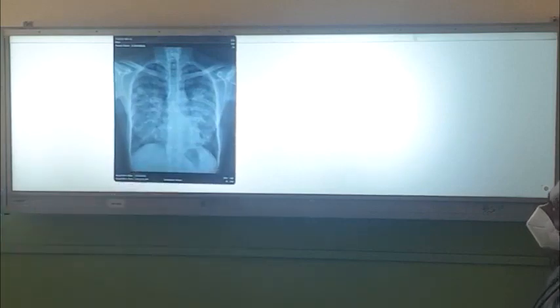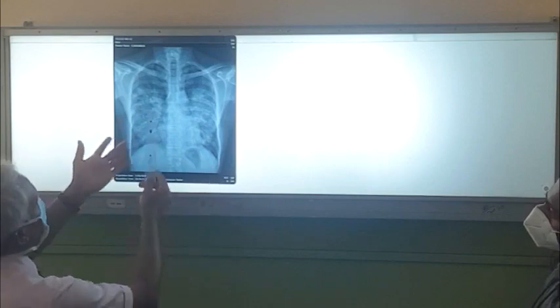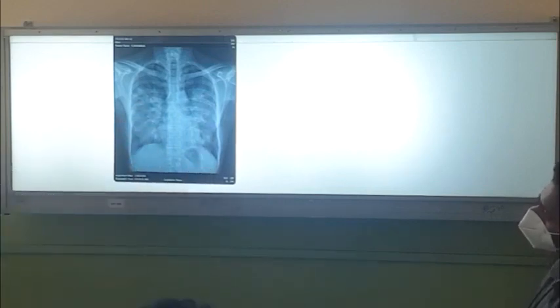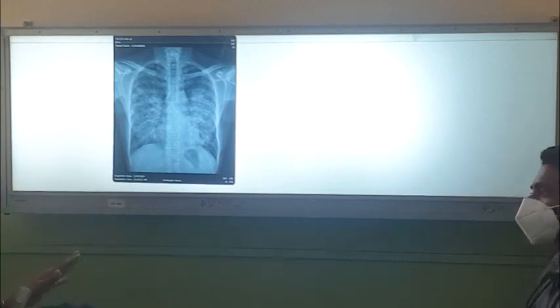This one transferred from the mother. Now we can't see the cardiac borders, perihilar, reticulonodular opacities are there, right? When you see this, think of pulmonary edema, think of atypical infections like pneumocystis, right? And the other thing is, you have to always think of lymphangitis carcinomatosis, so lymphatic spread of the malignancies.